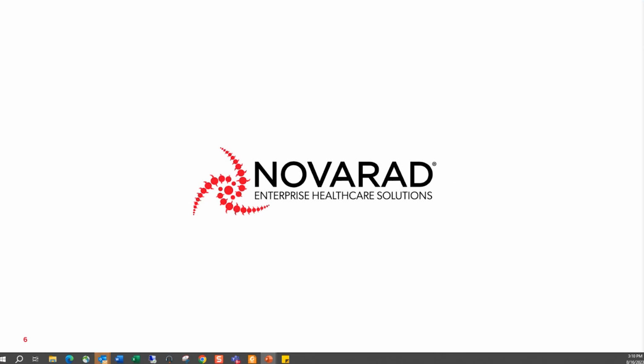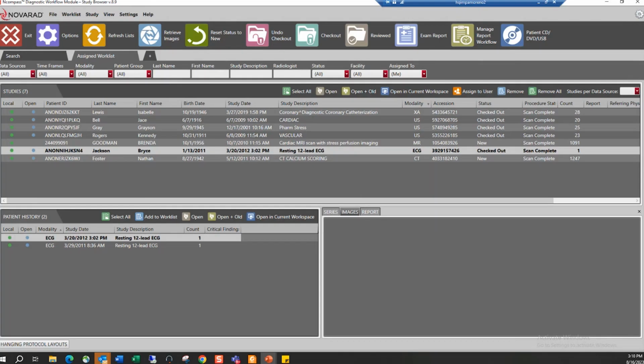And so I'm going to switch over to actually the PACS piece of how you can view these studies here. So I've launched into NovaRad already, and we identified some studies that are relevant to the Encapture MD and the NovaCardio piece. And they're big studies. I've retrieved them earlier. And I even did one more step of prepping for this, as I've already opened them. So with that in mind, let's go ahead and take a look at some of the studies.